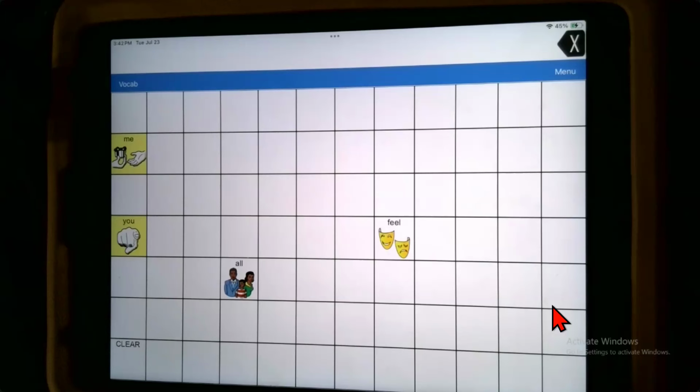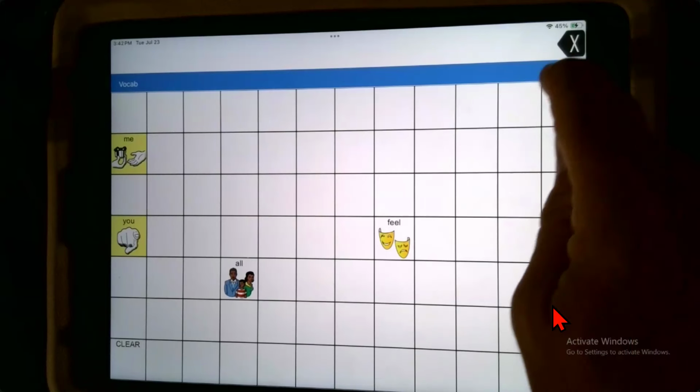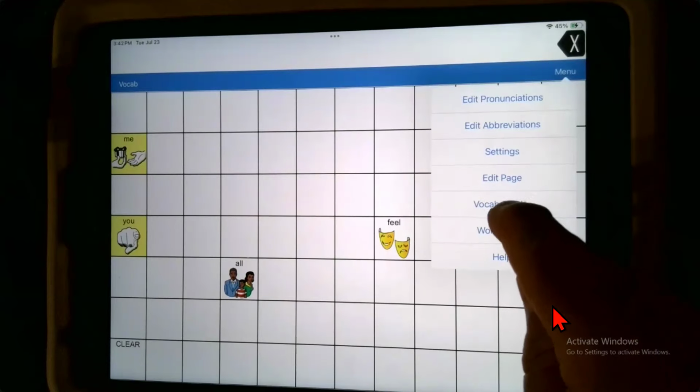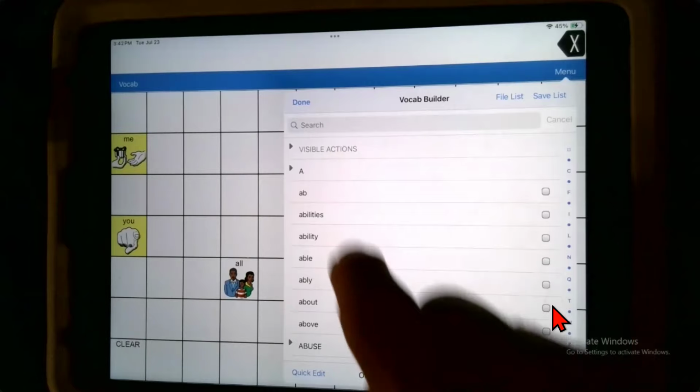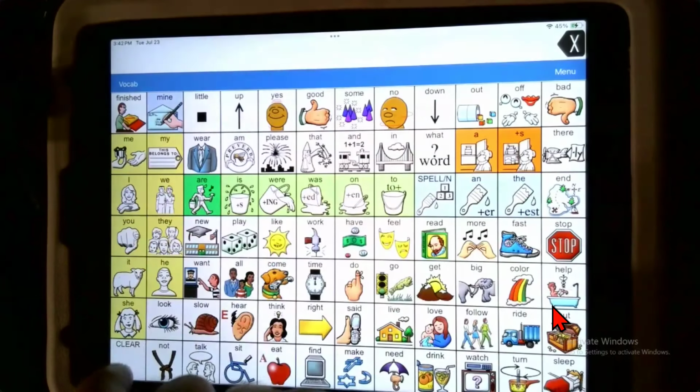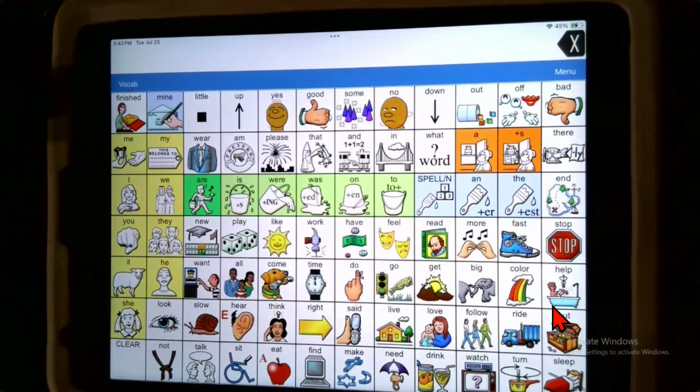All right. Well, I want to get you to what I really came here for. I walked you down this whole path because there was something I'm most excited about. I've got one more thing to teach you first, then I'm going to take everything I've taught you and hopefully it'll all come together. We all know that you have to be able to customize a kid's device.